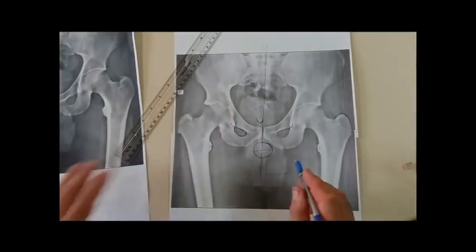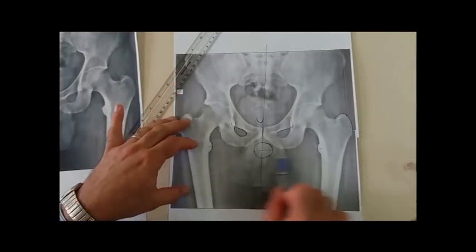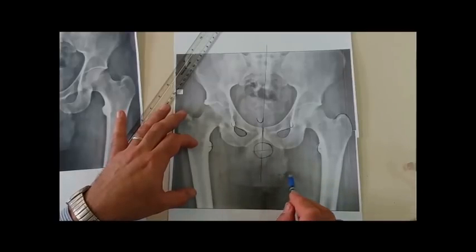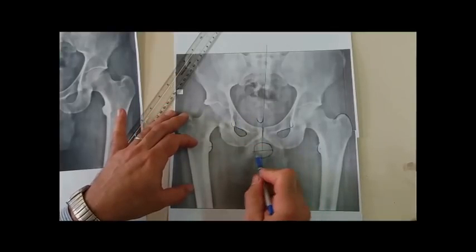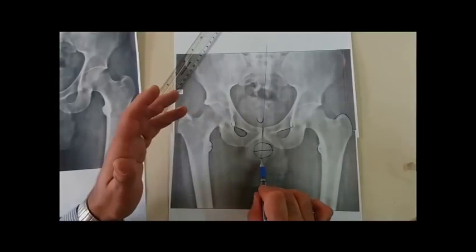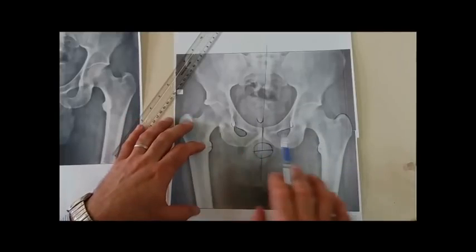We tie it between the two thighs of the patient at the level of the lesser trochanter, not directly on the cassette, not on the skin of the patient. So we put this metal ball, for example 10 millimeters, and we take a radiograph and measure this ball in the radiograph, and we can calculate the magnification. Of course, this magnification is much easier to calculate by digital planning. By the way, digital planning does not substitute for manual templating.